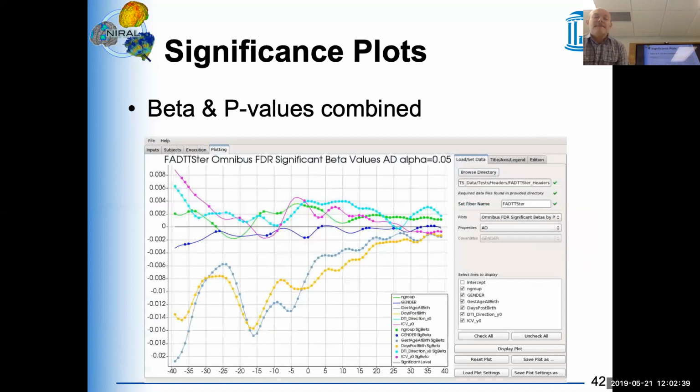Just one quick one. So the DTI fiber analyzer, in past iterations, you needed to run one fiber at a time. So if you want to speed things up and run multiple fibers in parallel, then you have to run each of the fibers with its own output directory.